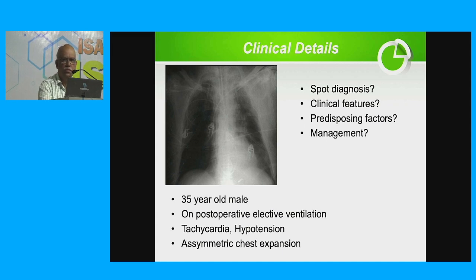One important clue is whenever you see a chest X-ray with ECG leads and an endotracheal tube, never say it is PA view. No patient in ICU can stand up and have a PA view taken. No patient will go to the X-ray room with ECG leads and an endotracheal tube walking. So that's the first thing. Okay, please go on.